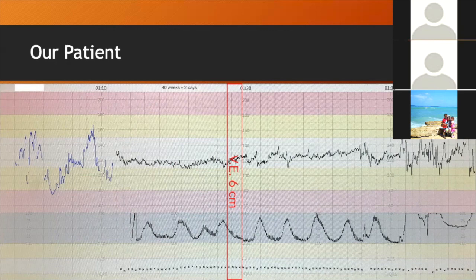Okay, so a little bit more detail. How do we set the baseline? How do we describe contractions first? So we said DR C BRAVADO: define risk, contractions, and we missed the Q, by the way. Yeah, the quality. Okay, how do you assess quality of the trace? What does good quality mean? No loss of contact?